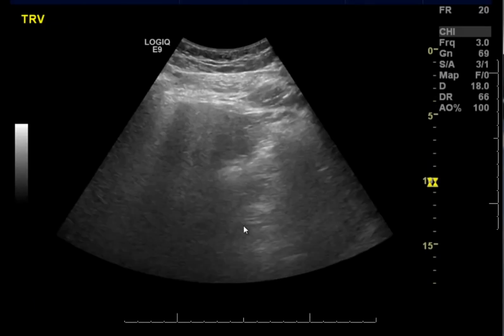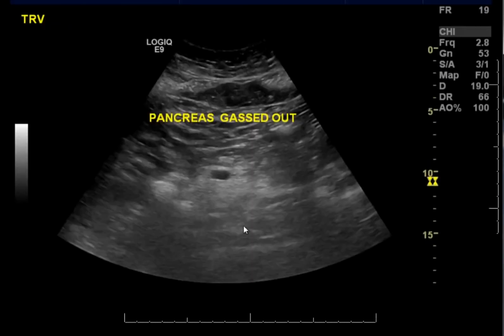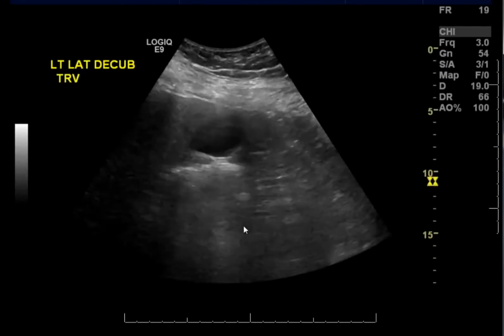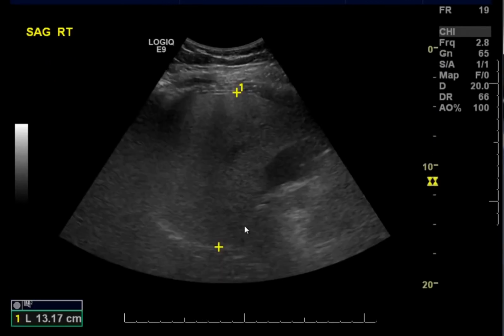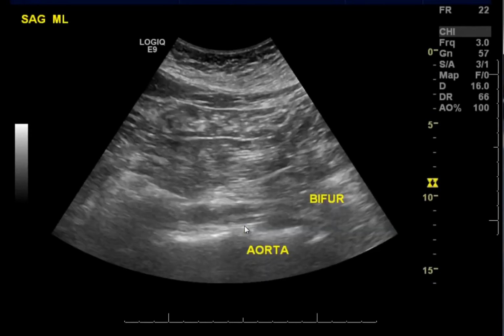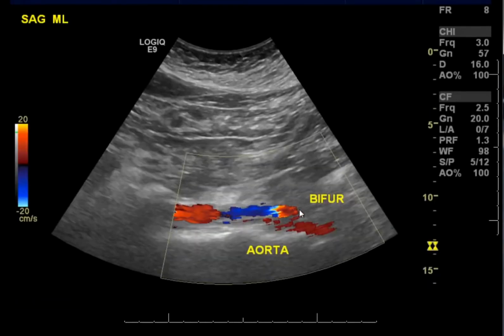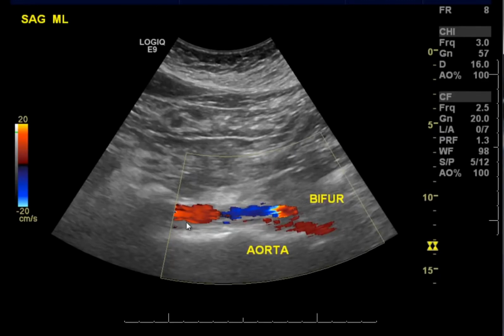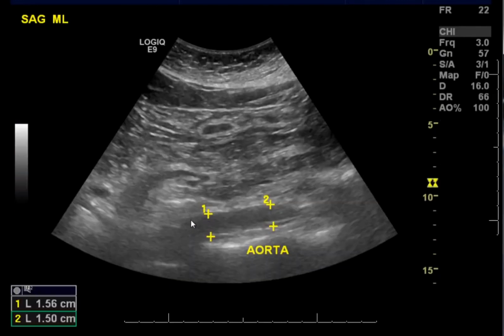So there is a Welcome to Medicare program. When males turn 65, they get a free abdominal aortic ultrasound looking for aneurysms, because aneurysms are not usually symptomatic. And then these would be the areas of the bifurcation into the common iliac. So just remember, I showed you the cava on the other case. This is the abdominal aorta in a limited fashion.